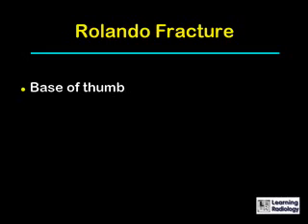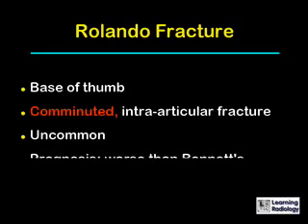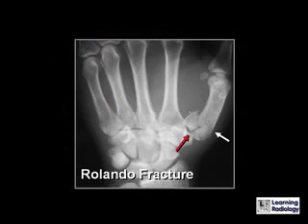A Rolando fracture also involves the base of the thumb. It is a comminuted intra-articular fracture. It's an uncommon fracture, and its prognosis is worse than a Bennett fracture because it is more difficult to reduce.